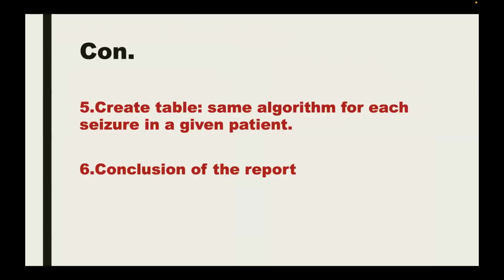Also, create a table. This is very important in presurgical evaluation. It is not for one or two seizures. In a 24-hour recording, we may have many seizures. So for more than one seizure, many patients with presurgical evaluation have more than one seizure attack. So this table helps in determining the focus. Then the conclusion of the ictal report.